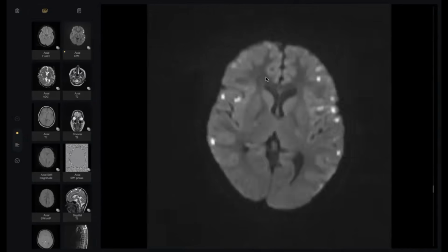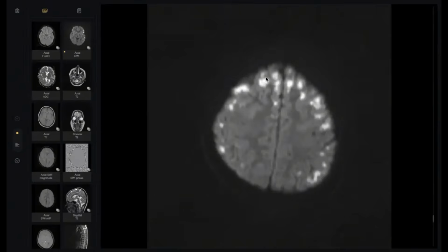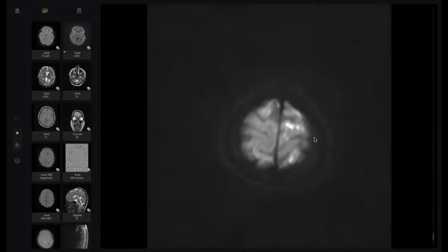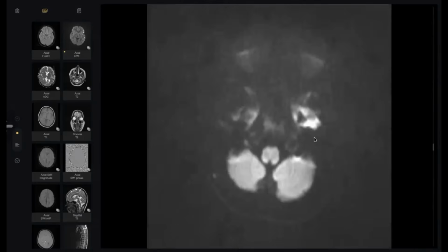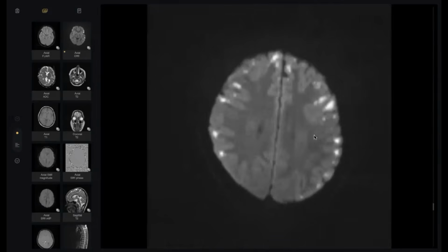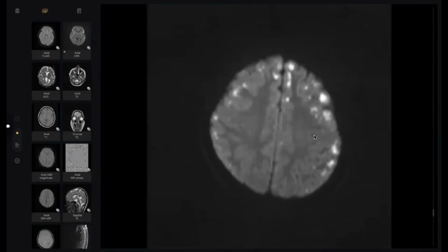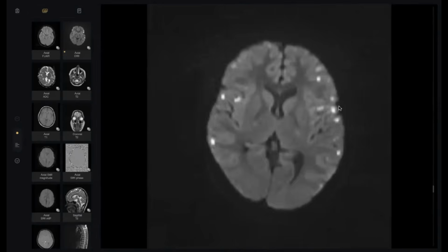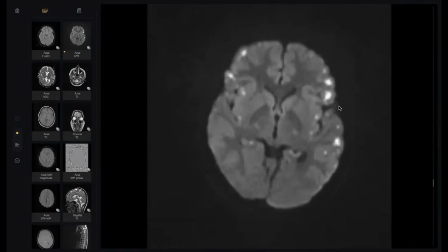Why do I refuse showering emboli? Showering emboli would give some infarction here, in the cerebellum. But in this patient, the distribution looks like affection of a specific part. After infection, we must think about vasculopathy or ADEM.